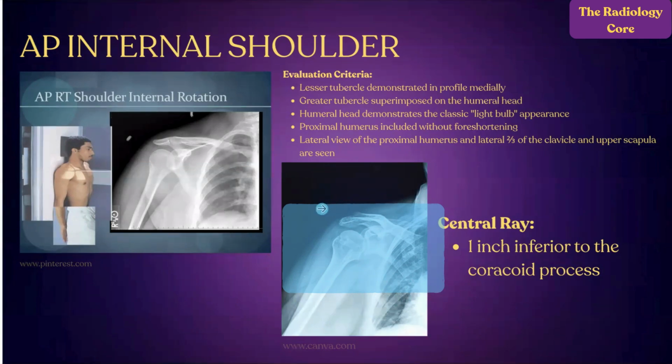So I'm seeing more of that anatomy and more of the scapula in its entirety, and it will be centered better, which means the exposure values will be more of a diagnostic image quality.